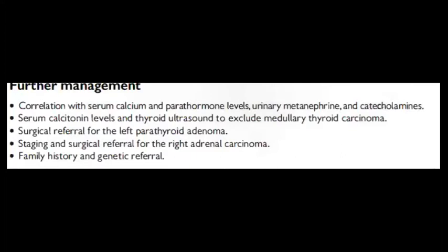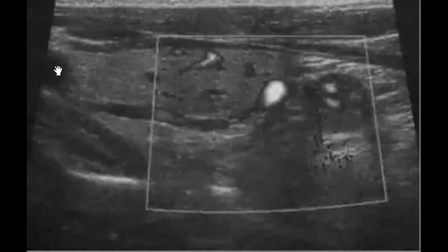For the exam, I see that everyone knows it already: in the ultrasound, when you see something related to the inferior pole, like this case, below the thyroid gland, a neck mass below the thyroid gland, this is the thyroid, and this could be the lesion linked to the inferior pole. So it could be parathyroid adenoma, or thyroid nodule, or lymph node. Yes.